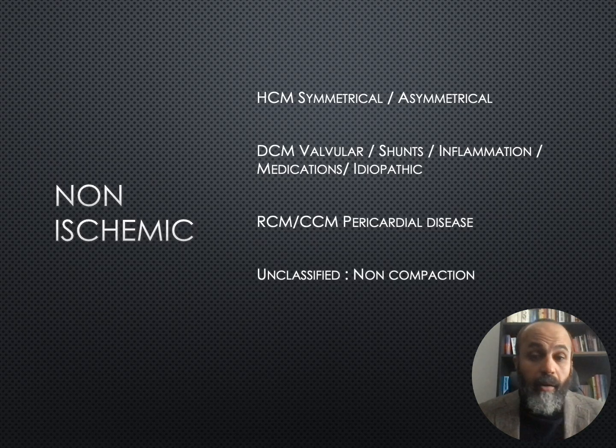Is it an athlete heart adaptation? So there is a long list of factors, or diagnoses, that I need to exclude before reaching that this is an idiopathic DCM. Of course, sometimes if you check on the localizer, it is the pericardium that is affected and that is affecting the heart from outside.